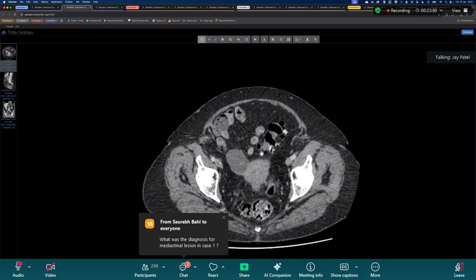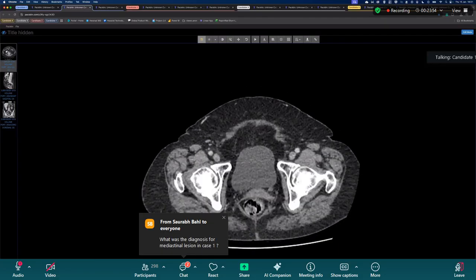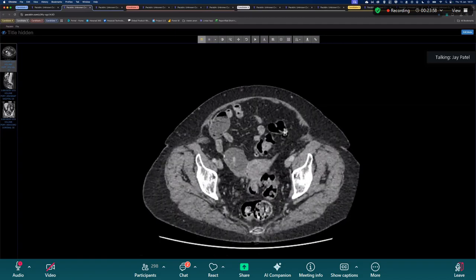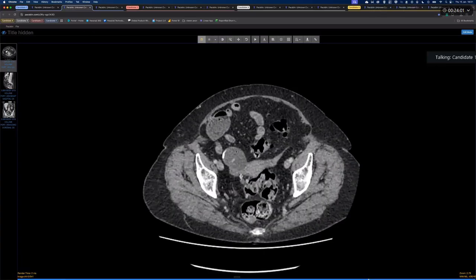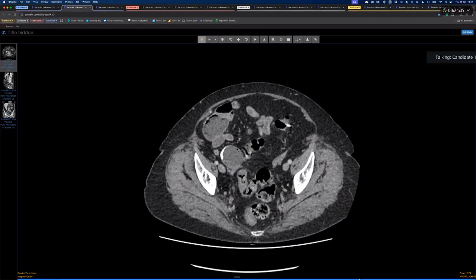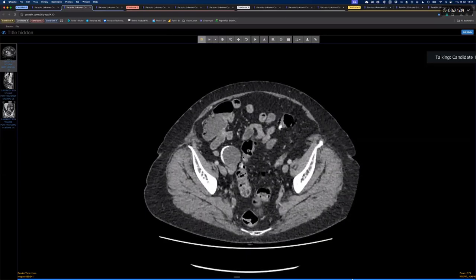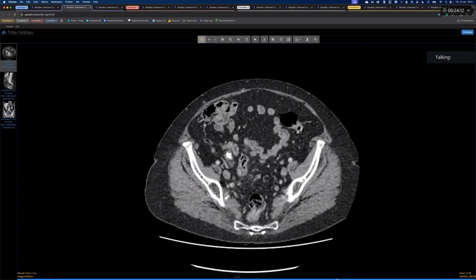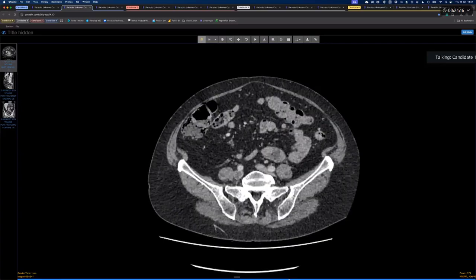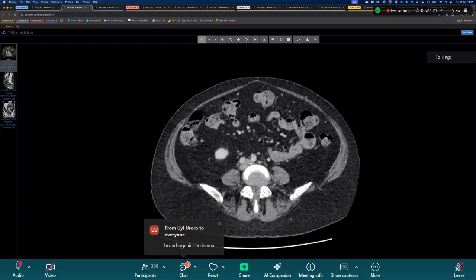Do you think that's enhancement or calcification? Seems calcification, very dense, peripheral, following the bone density. Okay. So it's likely a calcified right adnexal cyst. Other than that, it's not associated with surrounding fat stranding or collection. There is no significant lymphadenopathy in the pelvis.